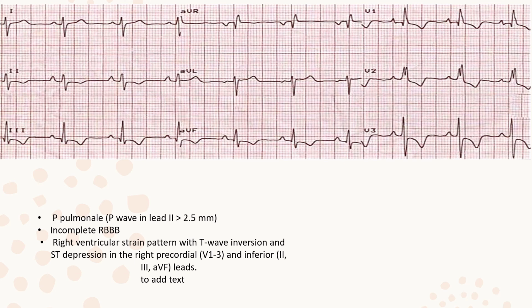I think it looked slow initially because it's enlarged. It looks to me like those boxes are kind of stretched out. When I put it in relationship with those boxes, my PR interval looks to be normal, so not a first degree. There's 1 P for every QRS. The QRS itself looks to be about 0.08, maybe 0.10. So that's not large.